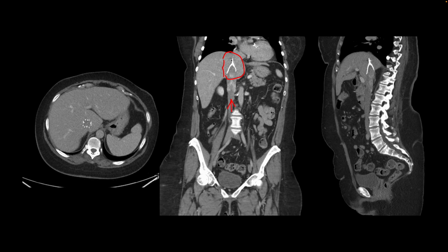And I think interventional radiologists can go through the internal jugular vein to the right atrium and pull it out in that direction. So that was performed to take this IVC filter out that had migrated from its normal location to the intrahepatic IVC.